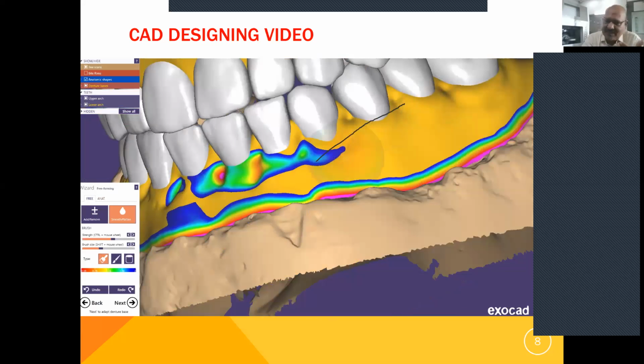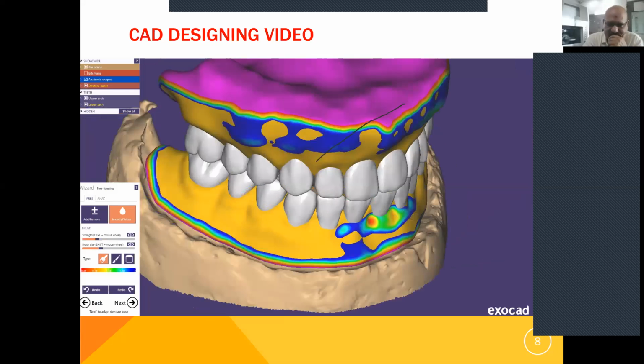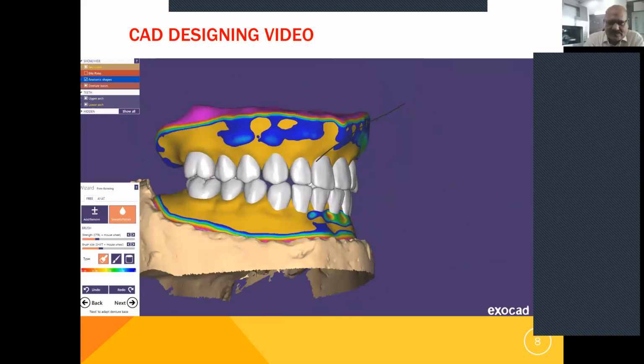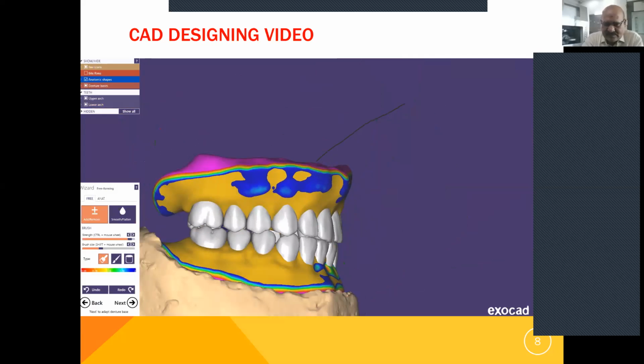So it can be made to look very lifelike.